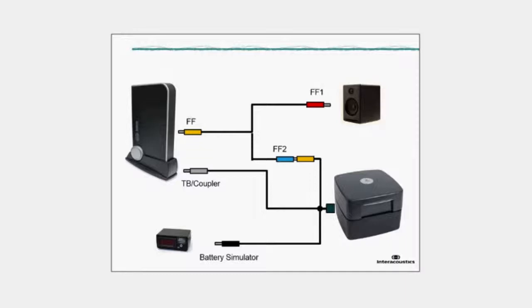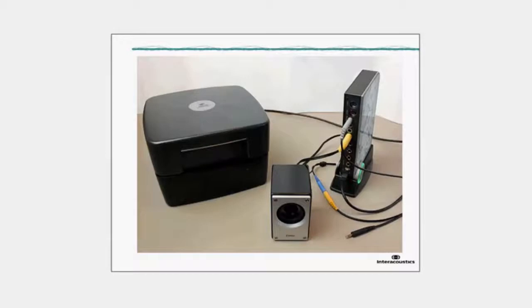And on the next page is a connected example of this as well. So here you can see the physical connection as per the diagram shown previously. Both this image and the diagram are shown in the additional information for further reference later on.